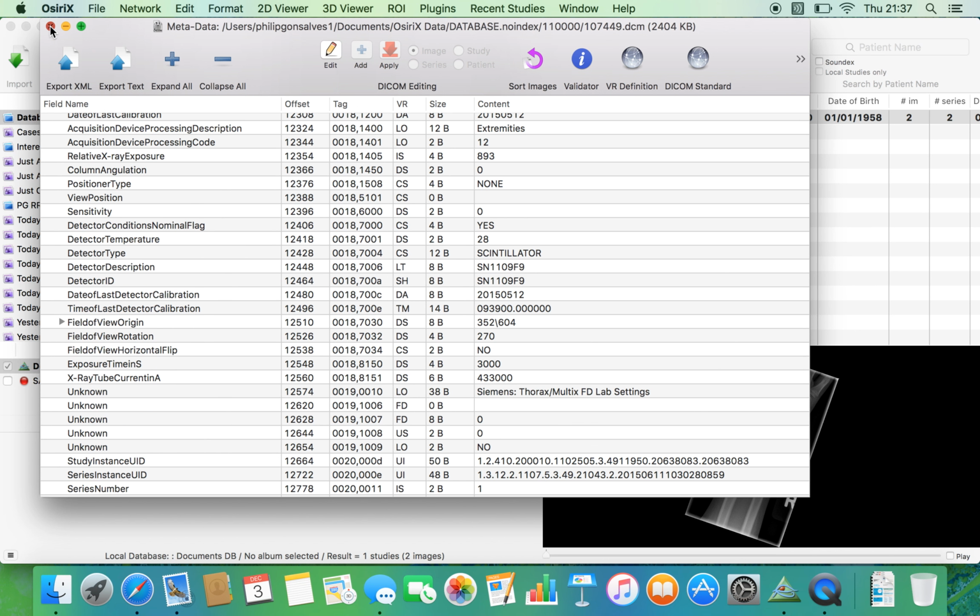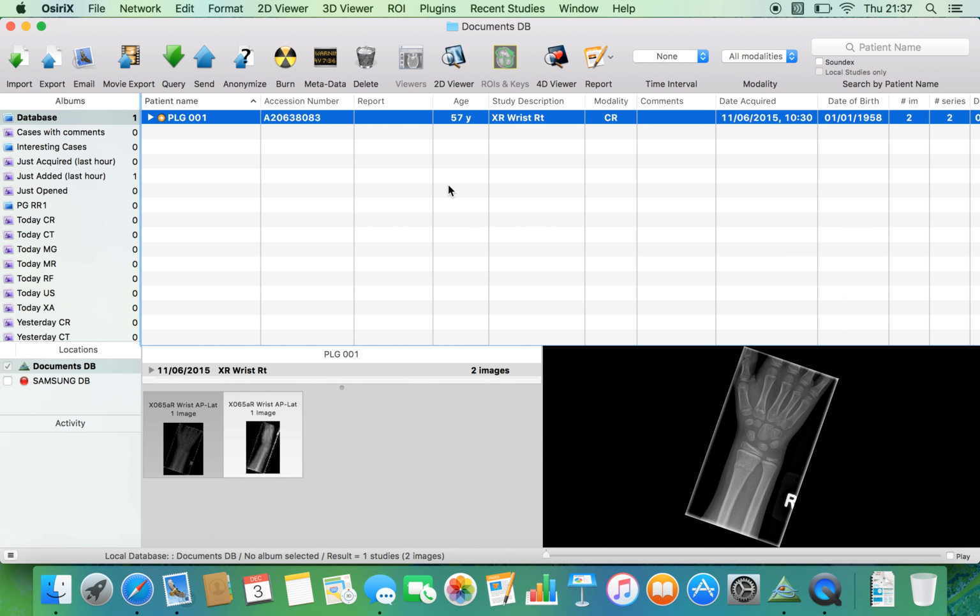Okay, so that's just a video to show you how to anonymize cases and how to check that you have actually anonymized all of the appropriate DICOM fields.